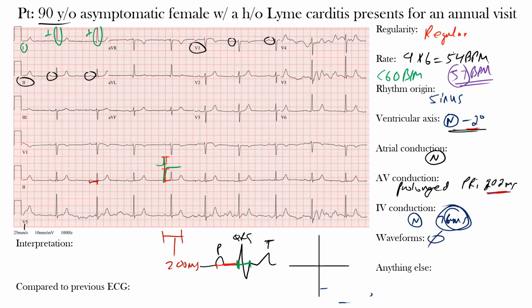So no new ones, and we'll move on next to anything else, meaning is there anything else that we're missing here? Well, how about the R wave progression in the precordial leads? Okay, so precordial leads are from these leads over here. Leads V1 through V6 are the chest or precordial leads. Normal R wave amplitude should progressively increase from leads V1 through V5 as we move from right to left across the precordium. In this case, it does seem that the R wave progression in the precordial leads is quite normal, okay, and not really a major concern to us.